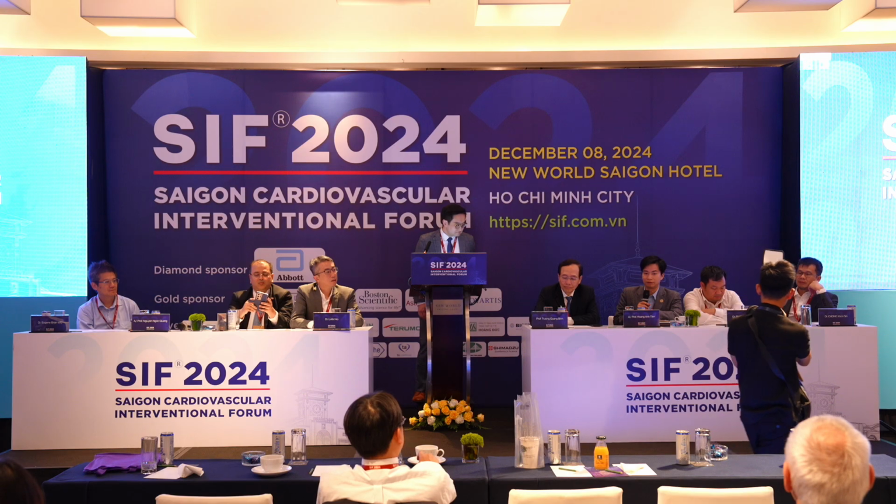Yeah, so a very interesting case, and you have a perfect result. And I have some comments. At the very first time when the patient was admitted to the emergency department, maybe we can use the EKG to find out the culprit lesion. For example, in this case, we can see ST elevation in D2, D3, and aVF, also in V5, V6, D1 and aVL. So it means it should be a circumflex lesion. Or we can see that the ST elevation in D2 is higher than in D3 or aVF, which may also suggest a circumflex lesion.